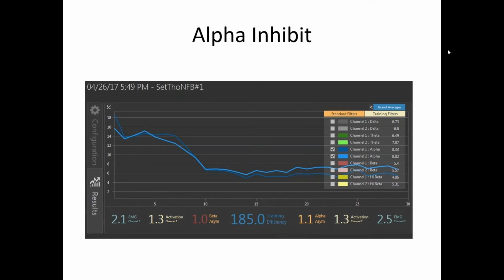We have a lot invested in this method of looking at things. Now there are alternatives. Looking at Z-score a lot of times, you'll just get rows of numbers that are colored, and you hope that the colors become nice.